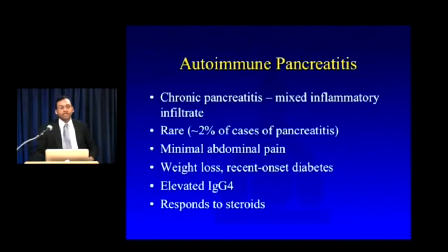Now, much more difficult as a diagnosis is picking up those rare cases of autoimmune pancreatitis. Now, I've got to say, during my training, I saw very few cases of this entity, maybe a couple. But now as an attending at Hopkins, and maybe it has to do with our patient mix here at Hopkins, I've seen lots of these cases.